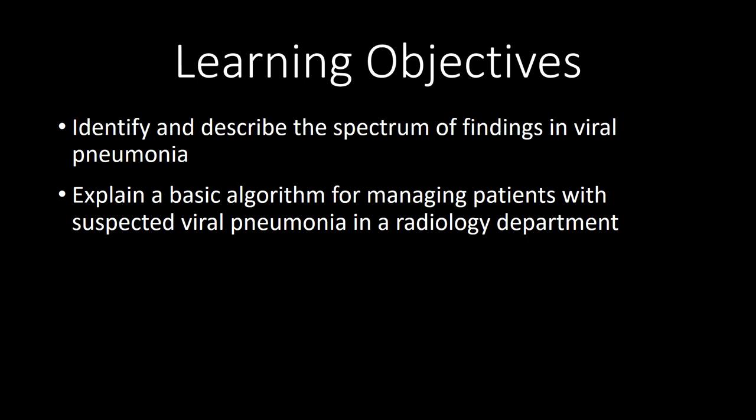At the end of this screencast, you should be able to identify and describe the spectrum of findings in viral pneumonia and explain a basic algorithm for managing patients with suspected viral pneumonia in a radiology department.